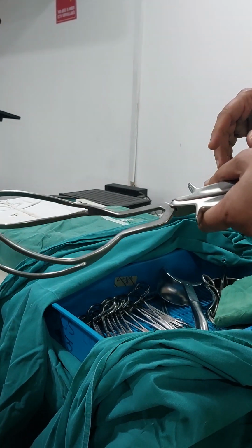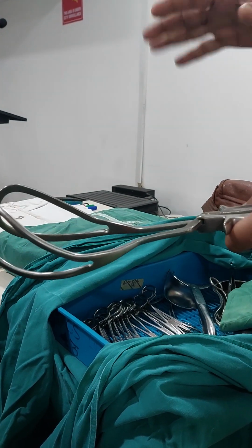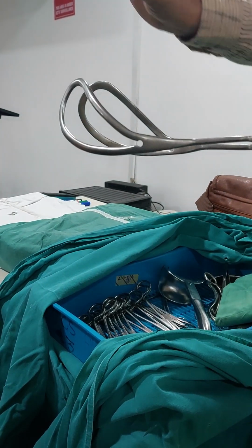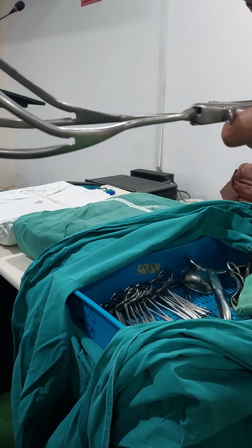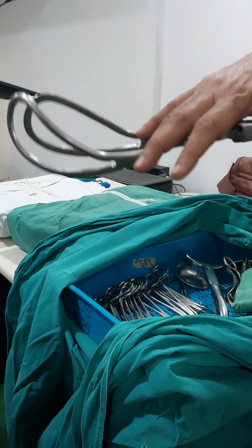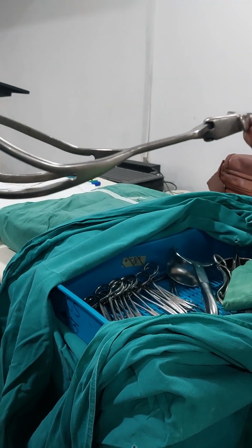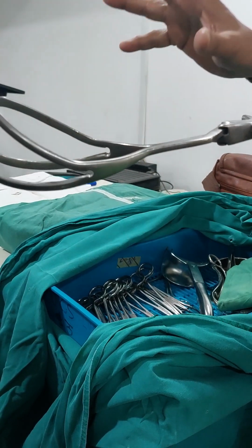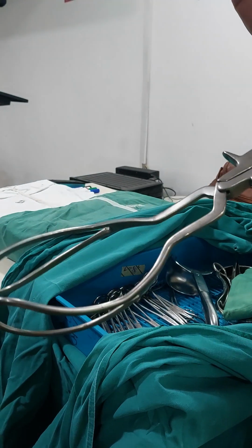And the application of forceps is what? It is only in case of vertex presentation or after-coming head of the breech. In the breech, the body is out, the head is stuck inside; that time you can apply the forceps. These are the two indications, there is no other indication. Before application of forceps, four things have to be fulfilled. One is the cervix has to be fully dilated, the bladder has to be empty. Third, presentation has to be vertex or after-coming head of the breech. And fourth, episiotomy has to be given.